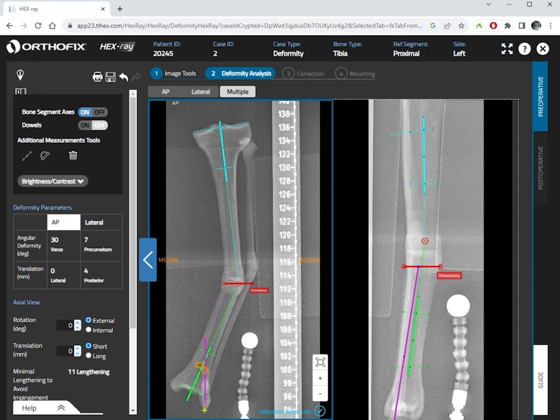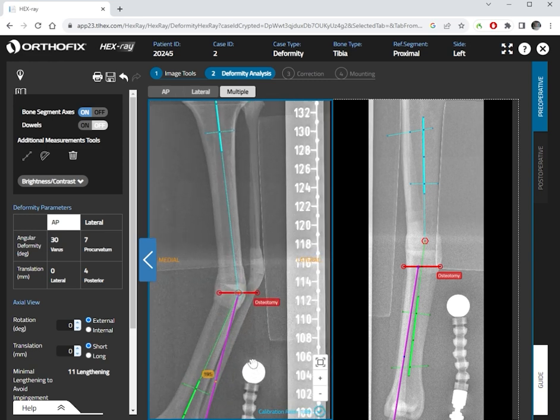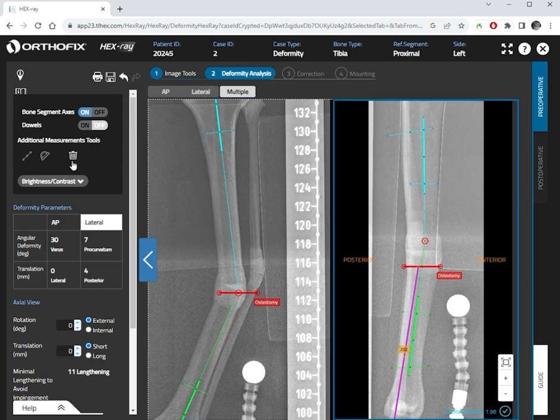Again, into the middle of the thing, and it measured 195. So this difference is related to the magnification or misplacement of the reference point. A few millimeter doesn't make a huge difference. So let's remove these, delete this one, and let's delete this one.